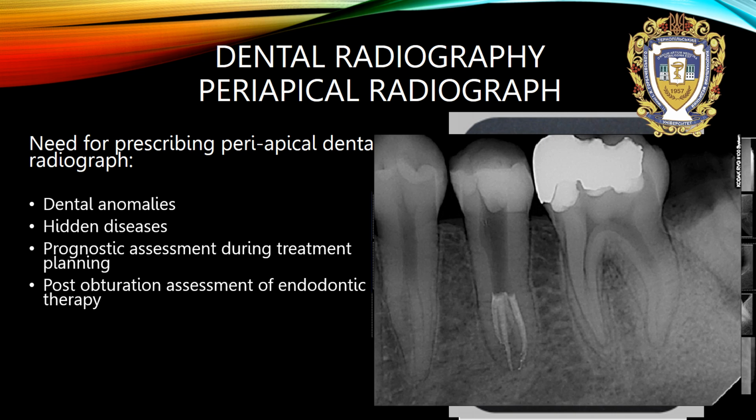Moreover, I think it is a specific patient because previously the tooth had 1, 2, 3 root canals minimum. Like the next tooth, where 1 root canal is divided into 2 root canals.